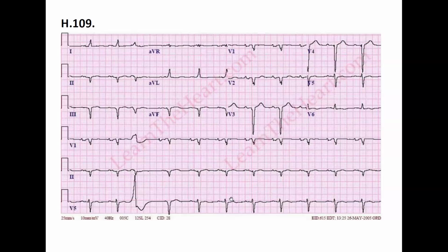I wouldn't say it's rhythmic, since we have some waves that are not coming regularly. If you are looking at only this part of the ECG, yes, it's rhythmic.